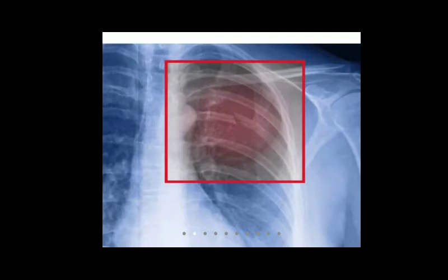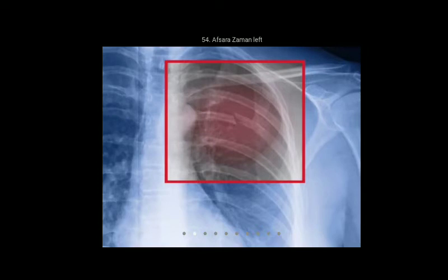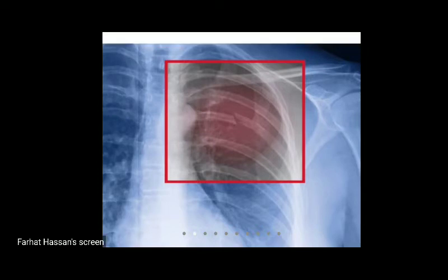Important findings on the neck: there is a raised jugular venous pressure, so the neck vein is engorged. Patient may present with features of shock. On examination there may be shifting of the trachea, on percussion there is hyperresonance, and breath sound is absent.